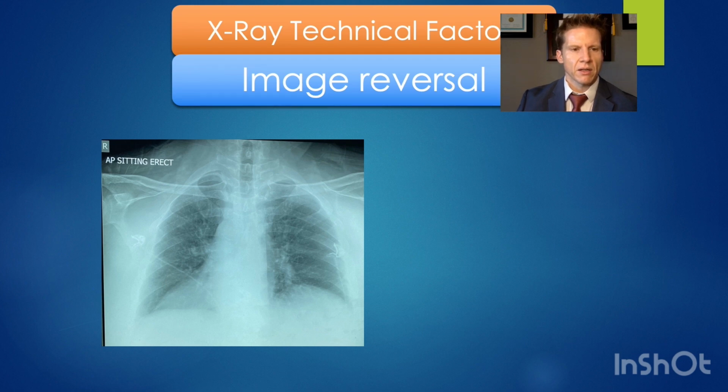And as we start assessing our mediastinal structures, the trachea here is deviated slightly towards the left, which should get your attention that there's some sort of opacity here to the right, whereas before when we went over the normal anatomy, we said that the trachea should normally be deviated slightly to the right because of the aortic arch. Now, if we file that away for a second and keep going, we notice that this left heart border looks very unusual and that the right heart border extends all the way towards the periphery of the lung.